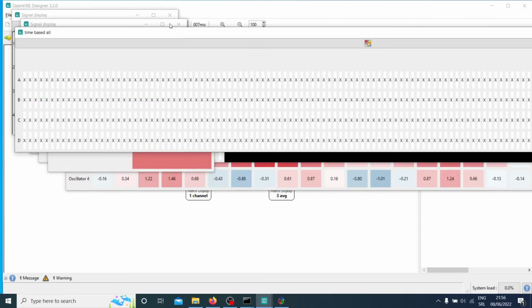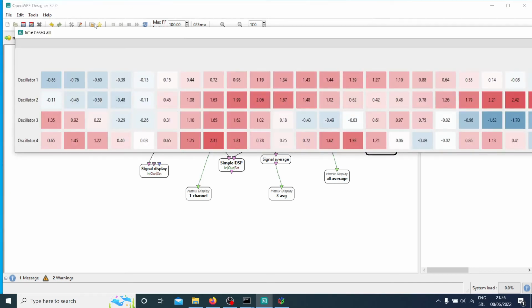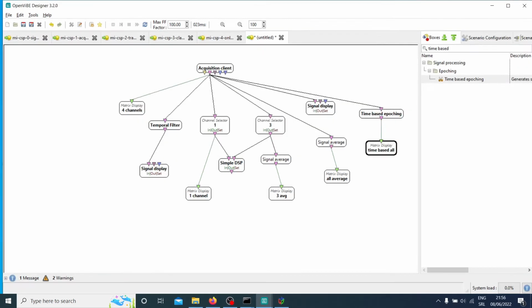Okay, oops. It's too much. I should have foreseen that. It actually happened a bunch of times. Okay, thank God it didn't explode. Or maybe it did. It's not working anymore. Ha ha ha. Oh, no, no, no. Please stop, stop. Did it stop? It did. Okay, it did not explode. Okay, thank God. I should have seen that.